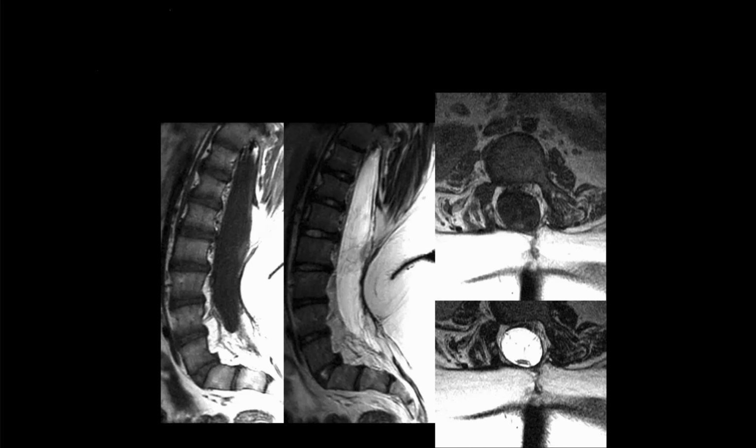Right, so this is another mass in the spinal canal. On the left, is that a T1? This is a T1. This is a T2. So it looks like fluid. It's dark on T1 and then bright on T2, so I think it's a cystic structure. There's that, and then there's this. And then there's a big defect back here, right? Yep. So what would you call this?